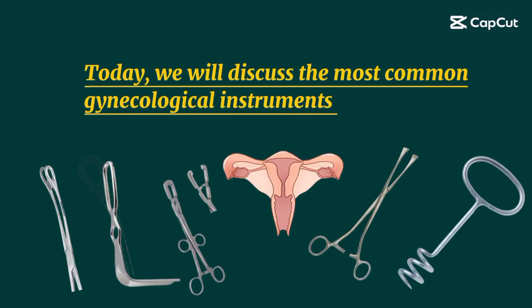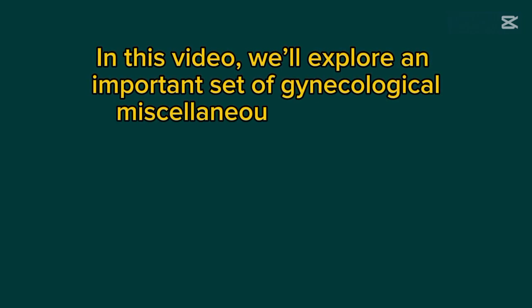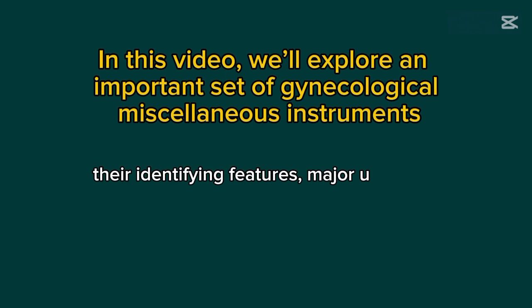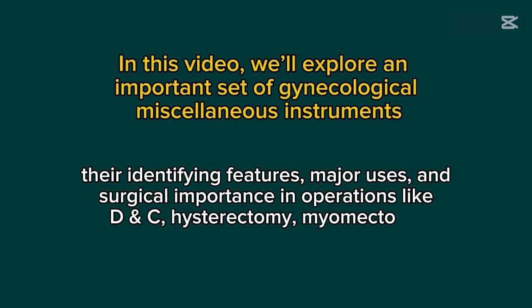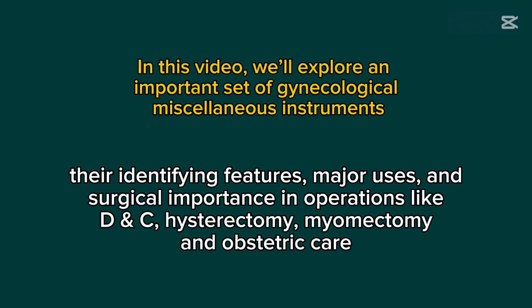Today, we will discuss the most common gynecological instruments. In this video, we shall explore an important set of gynecological miscellaneous instruments, their identifying features, major uses, and surgical importance in operations like D and C, hysterectomy, myomectomy, and obstetric care.